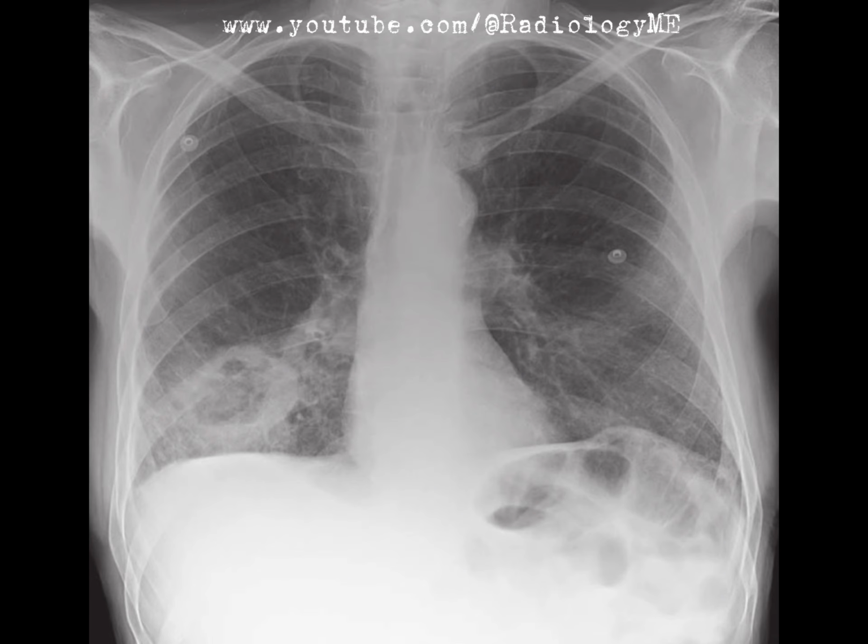However, the thick wall and irregular margins in this case push malignancy higher up the list compared to these infectious causes. An air crescent sign can sometimes be seen with infections, especially fungal infections, but in this case, it would seem more consistent with a malignant process. The clinical history would help guide this, especially in the context of TB or immunocompromised states.